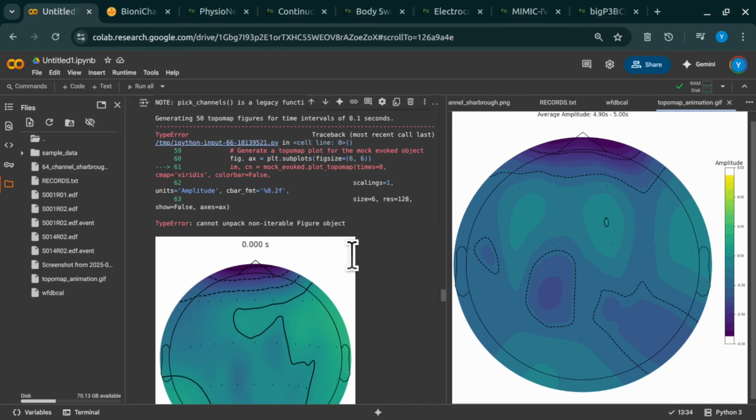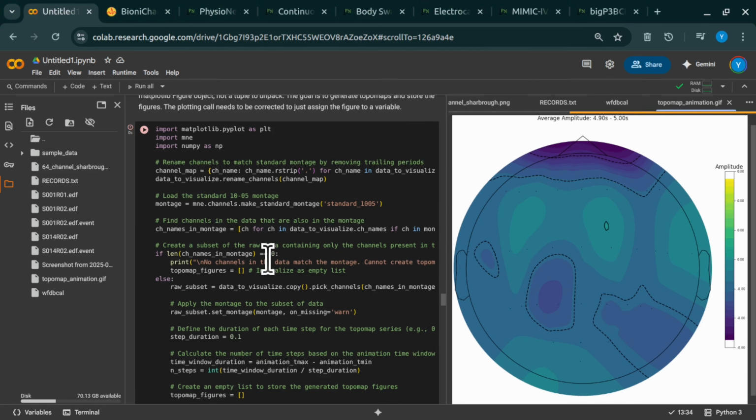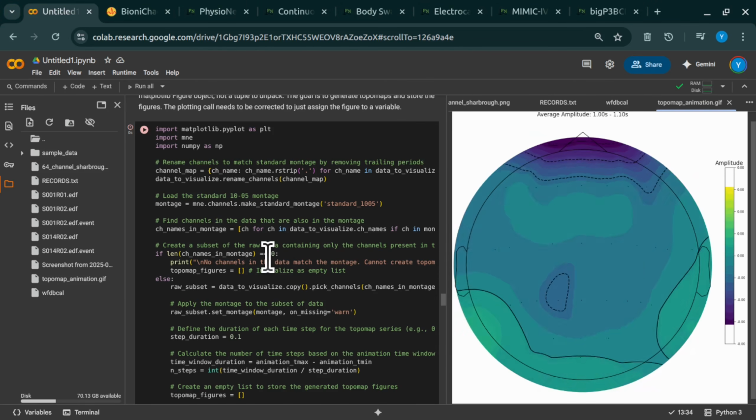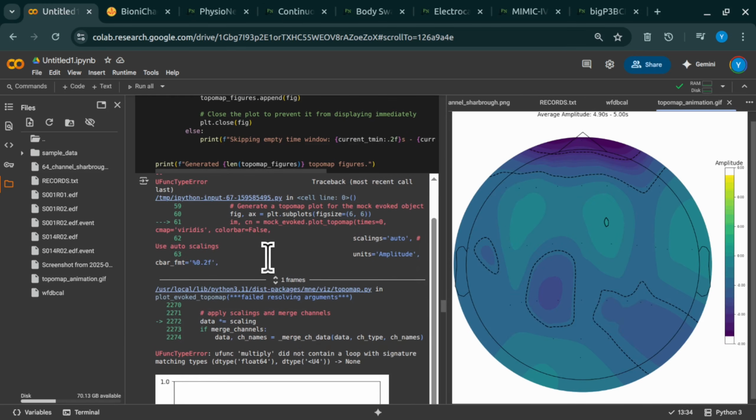I bet. After all that troubleshooting, finally getting that window of data. So what did you do with it? What did that first glimpse look like? We visualized it, plotted the raw signals for that epoch. It was our very first proper look at the brain's electrical activity around T0, seeing those squiggly lines finally appear. Yeah, that was satisfying. Puzzle piece found.